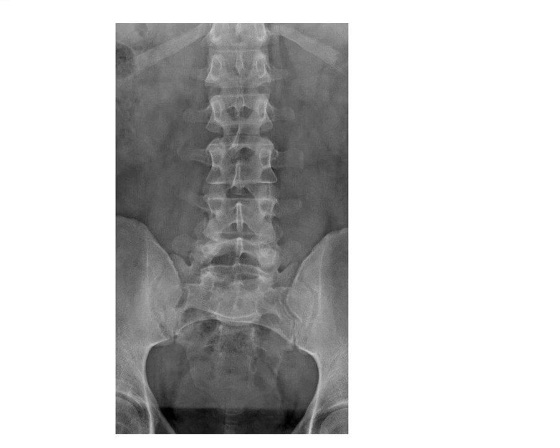The central ray would go at the level of the iliac crest, which is at lumbar level, lumbar 4 to 5. So let's take a look at this anatomy. First, I'd like to highlight the intervertebral disc spaces. So I'm just going to highlight those intervertebral disc spaces between each vertebra.